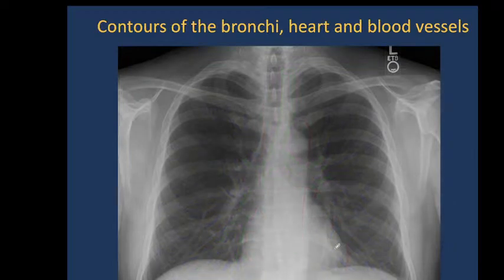An experienced doctor can see even some pathological process in the bronchi because they examine contours of these organs in the lungs and out of the lungs. So it is just experience.